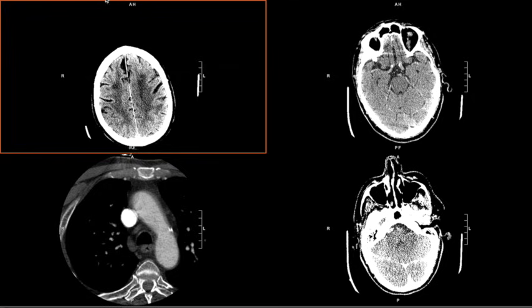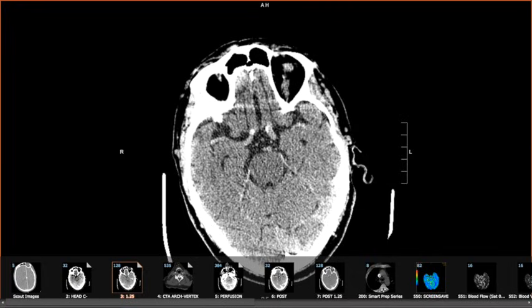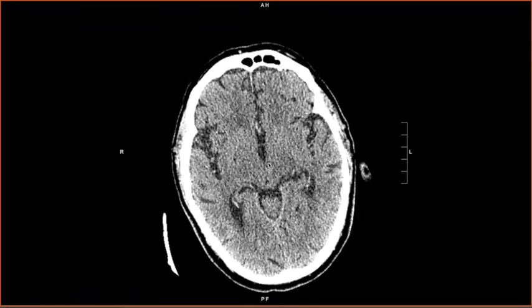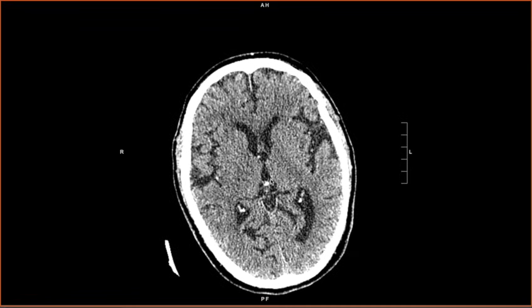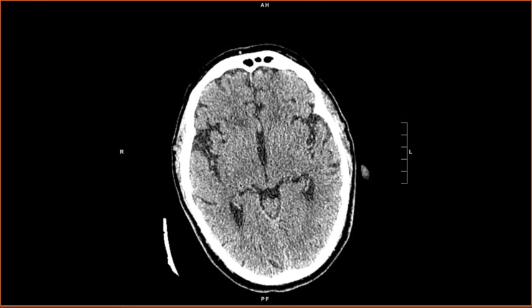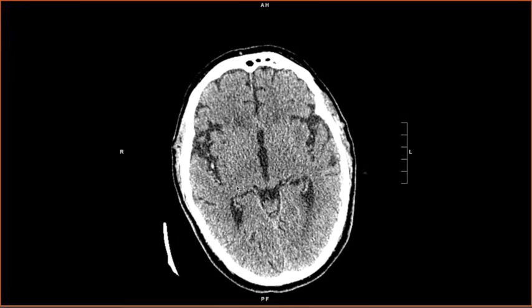It also demonstrates the point that the hyperdense vessel can often be very subtle. So you don't really see it here on the thick slices. But when you put it on thin slices, this is again a non-contrast, but in thin slices, and we look at the M2 branches in this area here, you actually see a hyperdense vessel here. Compare this with the other side. This is a hyperdense vessel that was not well appreciated in thick slices. So sometimes you can pull up the thin slices to look for it. But again, this is a subtle case. The point here is not the pathology, but the fact that if we go through our quick conceptual approach, we can catch things that are more subtle and we won't miss important pathologies.